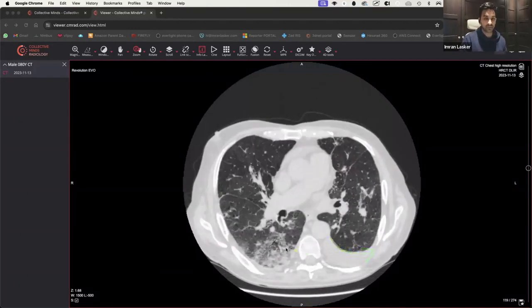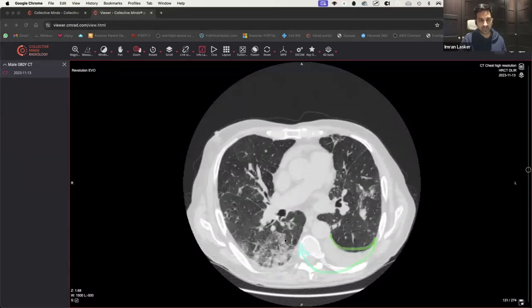For those that don't know what air bronchograms are, in consolidation, you'll have little airways which are not blocked up by pus or fluid or whatever it is. That's consolidation. But here, that's not consolidation. It's very, very well defined. Looks almost crescentic, and therefore that would be a pleural effusion.